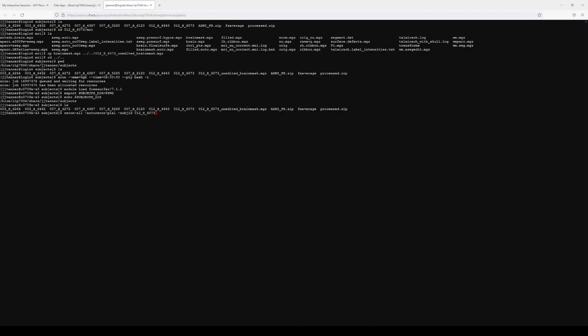So if you have one that you use to process, wherever your script is for your initial processing of FreeSurfer, you can just make a copy of that and edit it. Instead of running recon-all -s and then the -i and the path to that NIfTI file and then -all, you would do this recon-all and just replace that command with this.